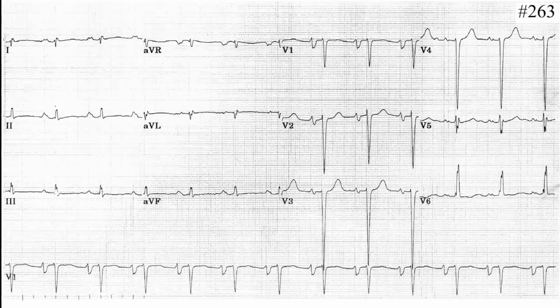Okay. Now, let's see this. Who is the next one? Vivian already. I think it's me who already solved an ECG. Yeah, I did. Oh, you did it. Who hasn't solved any ECG? Okay, everybody. So Adesso, it's your turn.